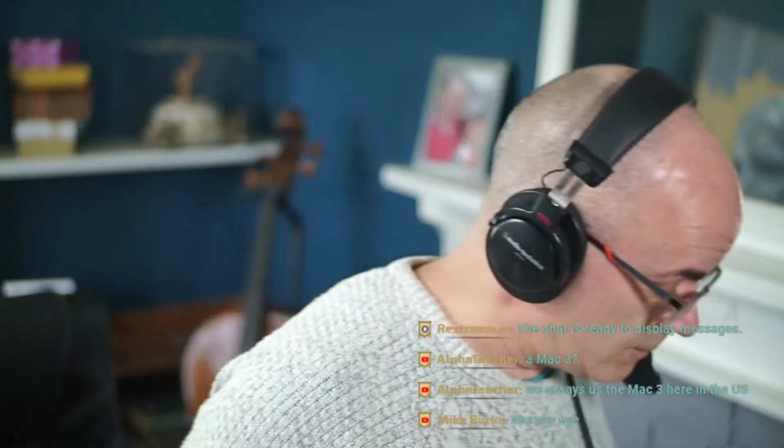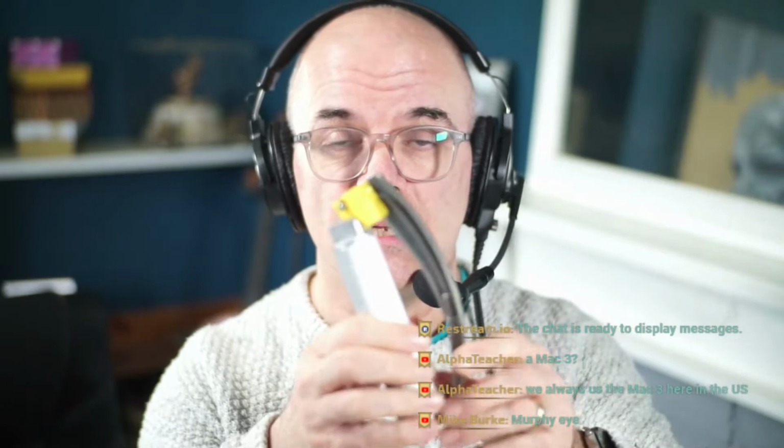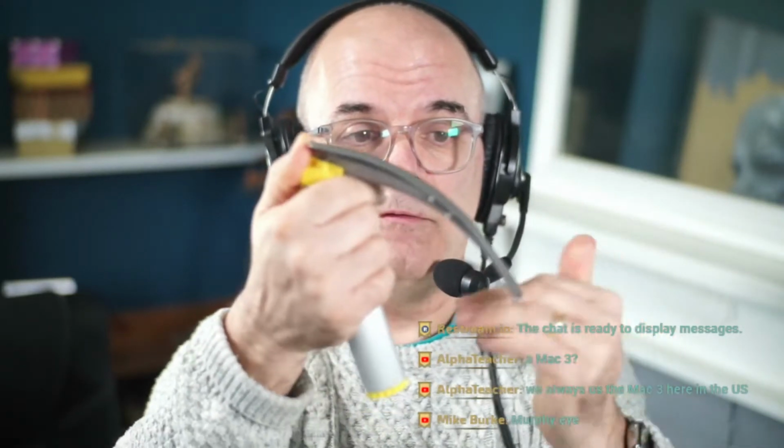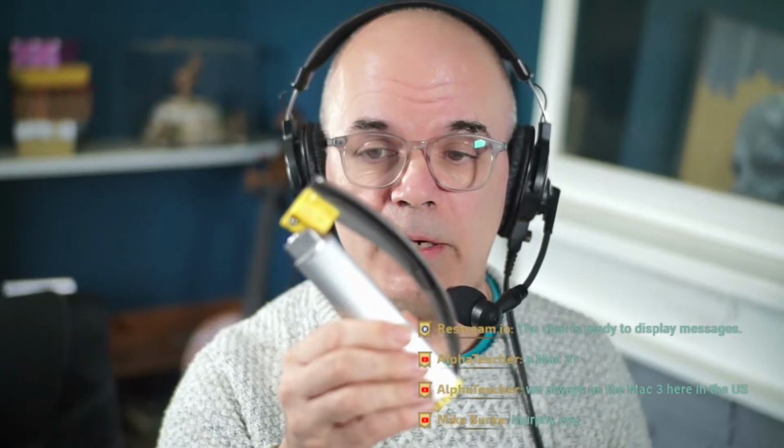The other thing that you might have as well with one of these is you might have slightly different types of blades. You can get McCoy blades. A McCoy blade is one with a little trigger on there that will flip this end up, which can sometimes help get that epiglottis out of the way. You can also get ones with very straight blades, but this is the one that's used routinely when we are intubating our patients.